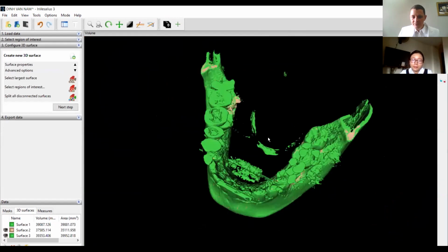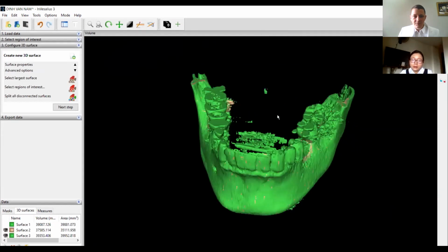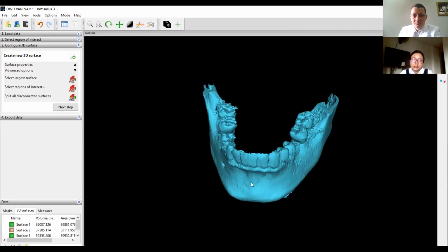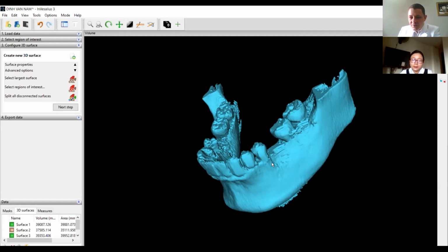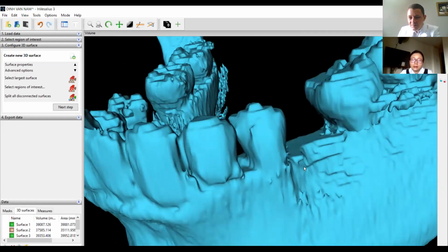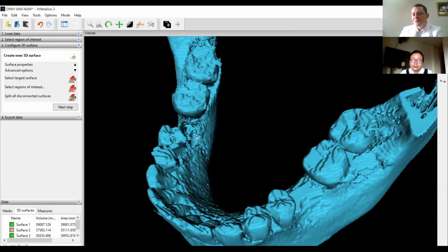Okay, so this is my new. Okay. So same. Đây là cái hàm mới mà mình đã xuất. Sau đó là mình sẽ ấn select largest surface, tức là mình chọn cái vật thể mà lớn nhất ấy. Chính là cái hàm dưới. Here all the bone I added. Thì mình sẽ thấy ở đây là những cái xương mà bác ấy đã thêm vào. When here there is nothing. Còn ở bên răng 46 thì mình không thấy cái gì hết.